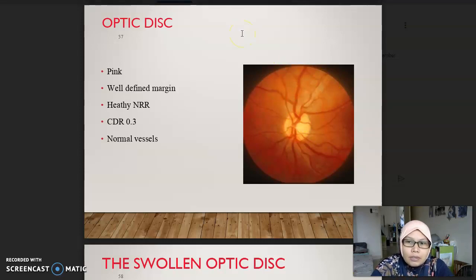However, please be reminded that the fundoscopic view is very magnified, and the field of view is very small. So sometimes what you will see is only this. The whole optic disc will fill up your whole fundoscopic view. Sometimes you don't know what this is. It's orange and large, looks like the sun. That is actually the optic disc. It's very bright yellow.